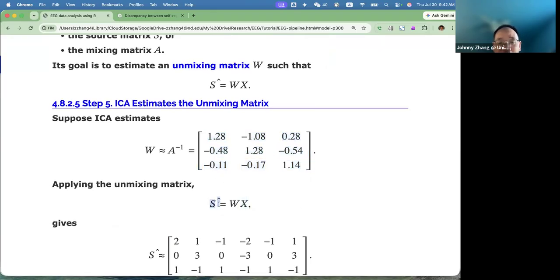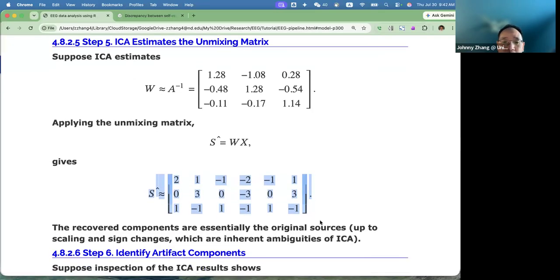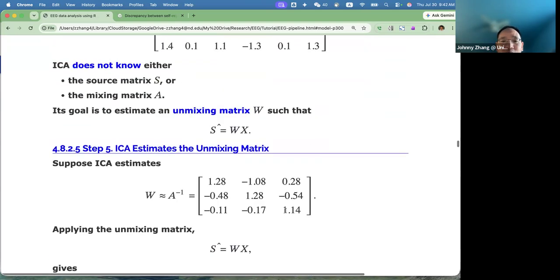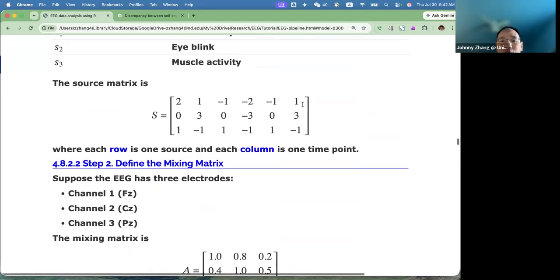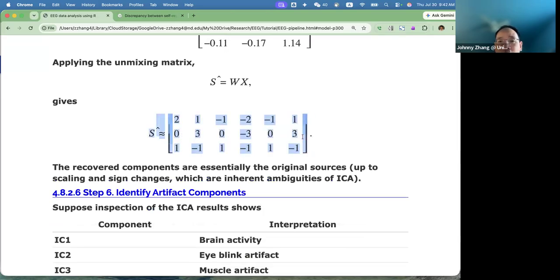And then we can get our independent components. So those are the independent components for each source of information. Certainly, here we assume we recover this very well, so this estimated source signals is actually the same as the original signals here. But remember the difference is, those are calculated based on our data. Those are not the true sources we know.